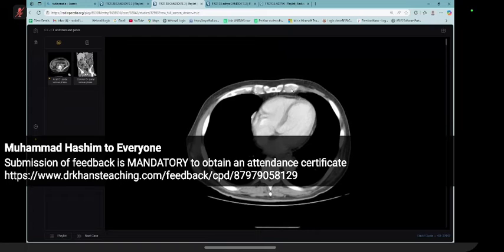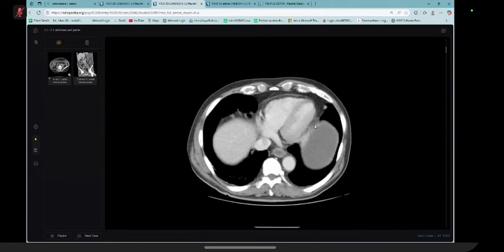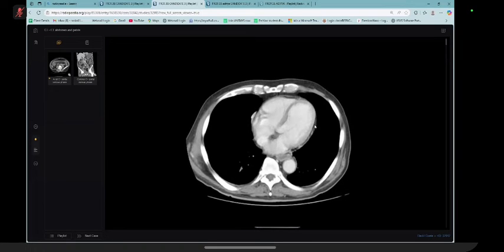You need to start with the axial images. And the patient has presented with a 50-year-old male patient, and the ED clinician is suspecting bowel obstruction because there is constant vomiting. If you could have a look at the scan and rule out or rule in bowel obstruction, give your comments and manage this patient for me, please.